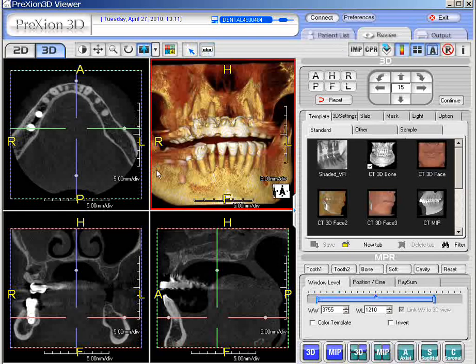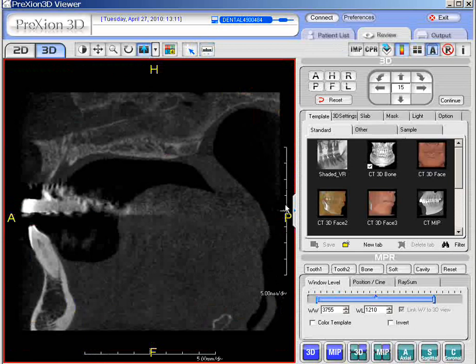Now, you also have the ability to take a calibrating. Notice that there are calibration marks with all of the images, and what we can do is just double click on one to load. You can actually grab the bar itself and scroll over the bar and put it across any area to determine what your measurements are. On the bottom you can see each of these individual divisions is 5 millimeters. So this is a 5 millimeter portion here, this is a 5 millimeter portion here, etc.